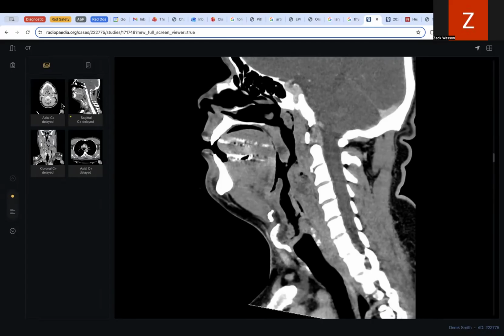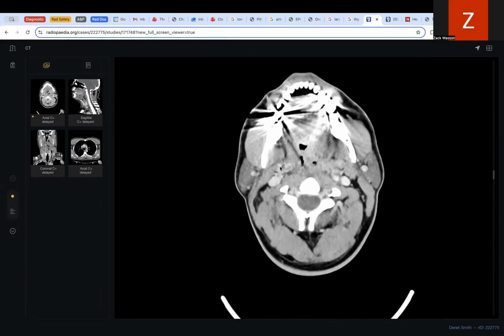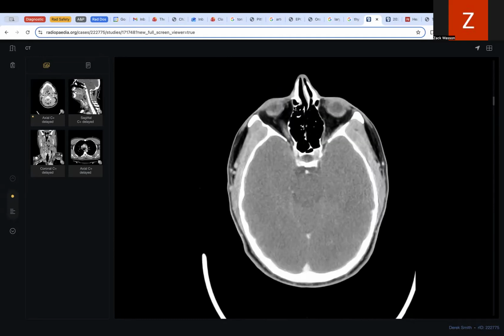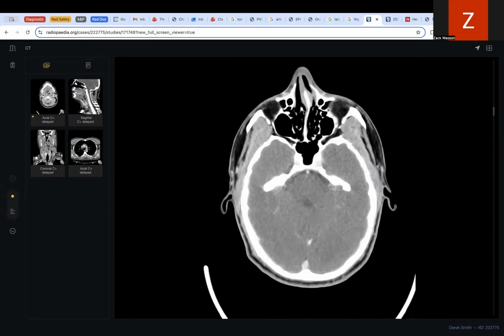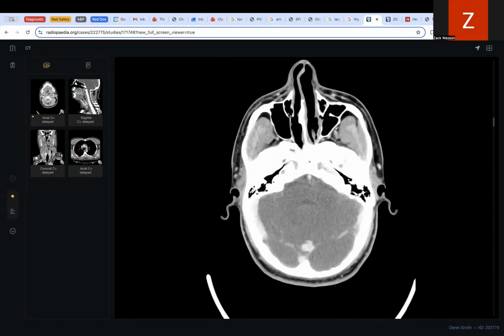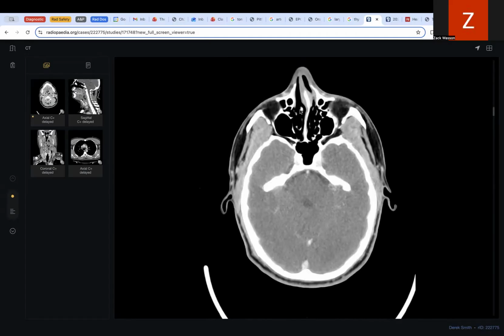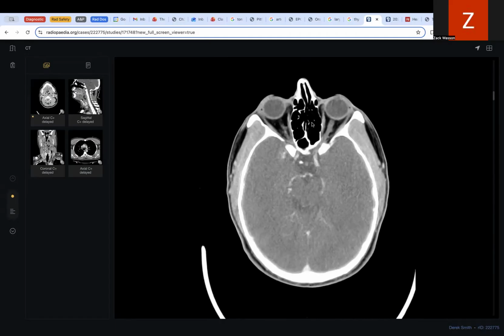Okay, I'm going to move on to the axial view. Go up here, we've got the brain, eyes, and then we can see the nose here, and you can see this nasal septum come right through. That's a bone right in the middle of your nose. You can feel it. And as I said earlier, you can see these two maxillary sinuses, and then you can kind of see where the nasal concha are going to be, your sinuses in the middle. We'll see that on the coronal view.